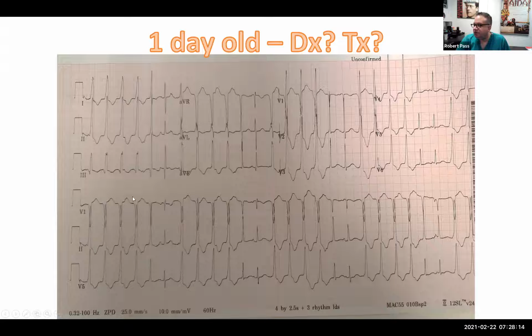And in the accelerated ventricular rhythm, there appears to be ventriculoatrial dissociation. And so this is an example of a so-called automatic arrhythmia. It's a form of VT, or accelerated ventricular rhythm, that you can see in a newborn. And so the baby looks well, it's completely hemodynamically stable.